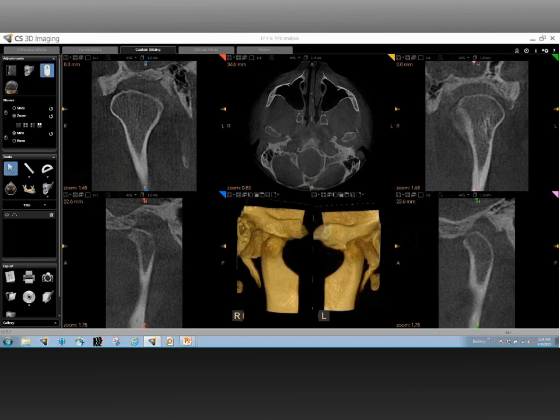And besides that, if you look at the lateral view, you can notice that there is the eminence, which is nothing but the articular eminence. This is visualized bilaterally. The eminence is a very critical component to the TMJ, since most of the TMJ movements are related to how it's oriented with the articular eminence.